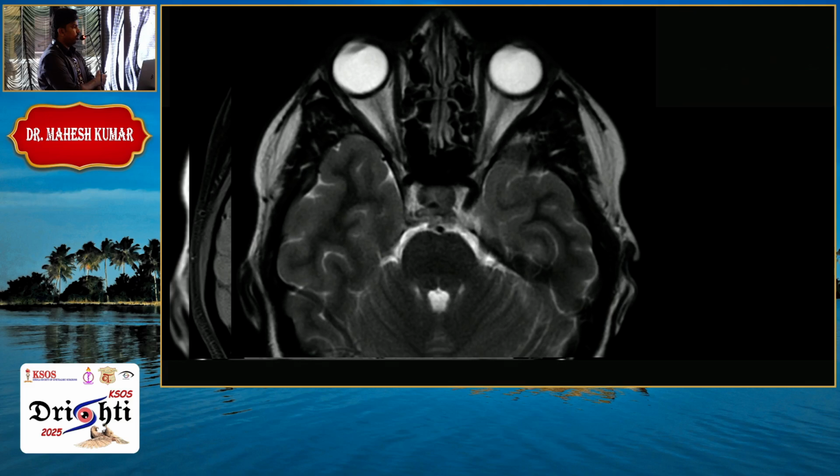And this is the T2 image that we have seen. Let us learn a small point about anatomy here. As we are coming posterior into the sellar region, this is the sellar region. This black color structure that you see on both sides is called a flow void. That is because of the internal carotid artery on both sides of the sella at the level of the cavernous sinuses.